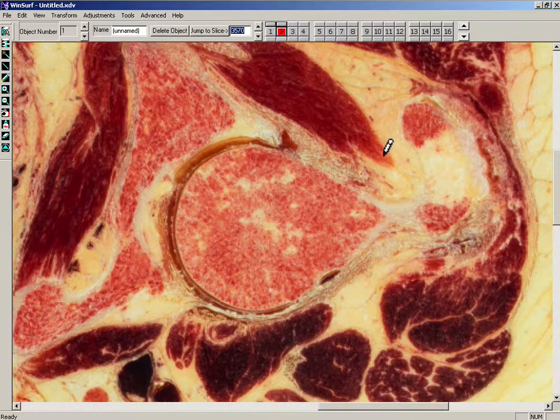This is once again the trochanter in red. Of course, you have to take the same color for the same entity. You can stop some dots by hand, but it's better to draw with a free hand.